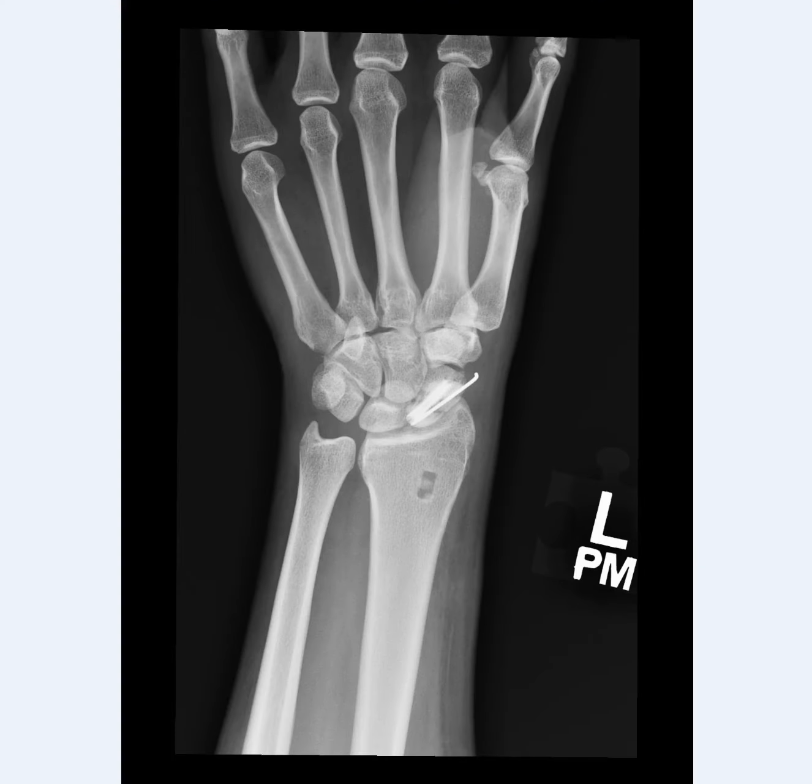Now these images are post-operative. We can see that there is a screw and pin placed in the scaphoid longitudinally. The screw is fully encased in the scaphoid, and the screw is holding together the two ends of the scaphoid to help with the displacement. You can also see the area where the bone graft was taken from the distal radius here.